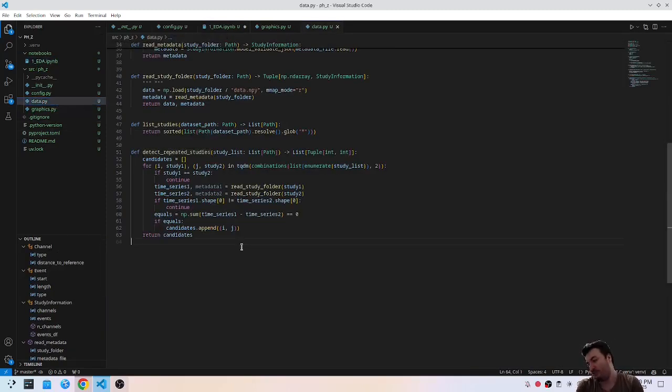So what should we do? So maybe it's just, we have the time series, we can create windows. Maybe what we can create is just an additional column with ones when the event is present, with 0 when the event is not present, and then using the Keras utilities for time series and just creating the time series in windows.